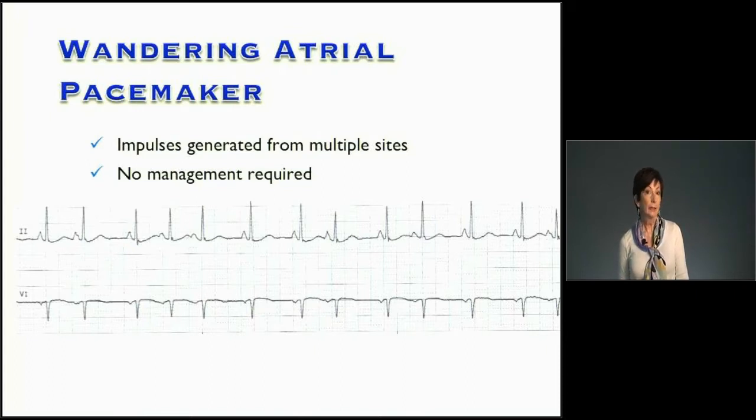So you really cannot expect your QRSs to be regular, because the QRSs are responding to the atrial impulse. And it's unlikely that multiple atrial sites would be firing at exactly the same heart rate.